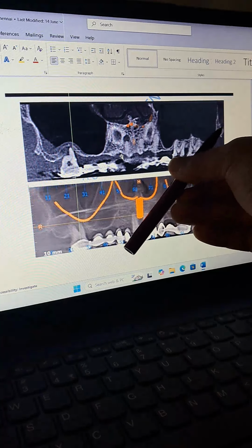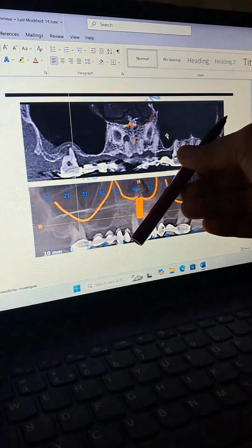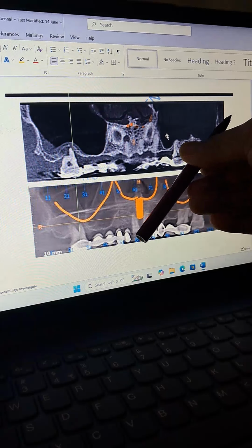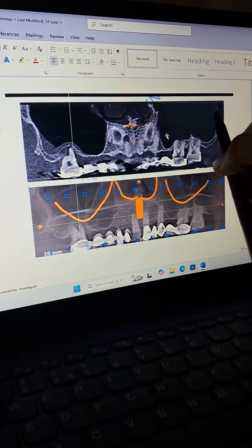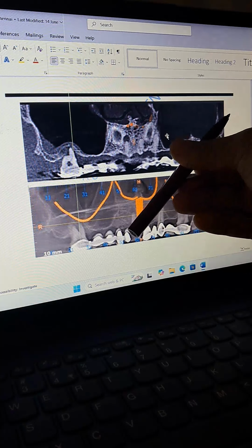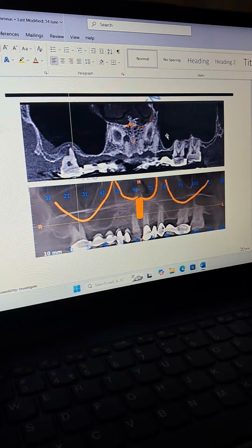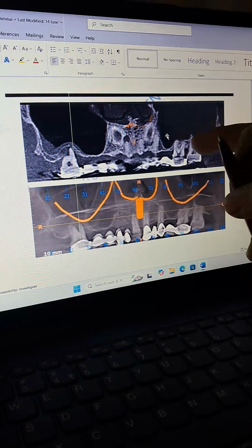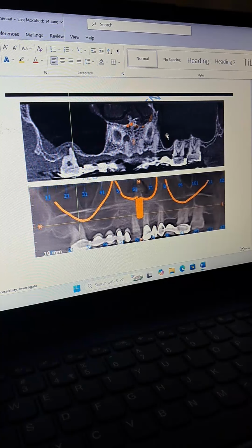The moment I go more vertical, I am in the middle of the fusion zone. That means it will be difficult for me to place a second pterygoid in this area, because the fusion zone is over here. If I am placing my first pterygoid here and the second pterygoid here, I am going a little higher and traversing a lot more distance through the sinus. Invariably both the second pterygoids are always through the sinus in these kinds of no-bone cases.